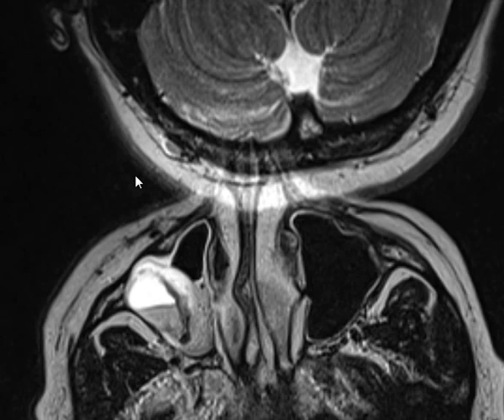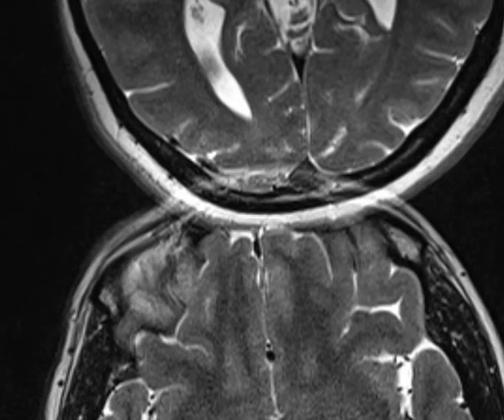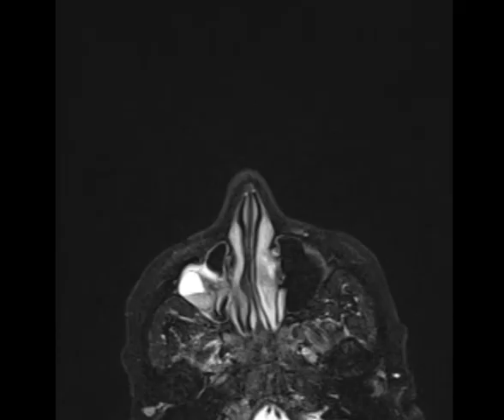It's exactly the same as aliasing in Doppler. When it's a small field of view you have wrap over. Sometimes it happens. Let's do this one. See, big field of view, no wrap around artifact.